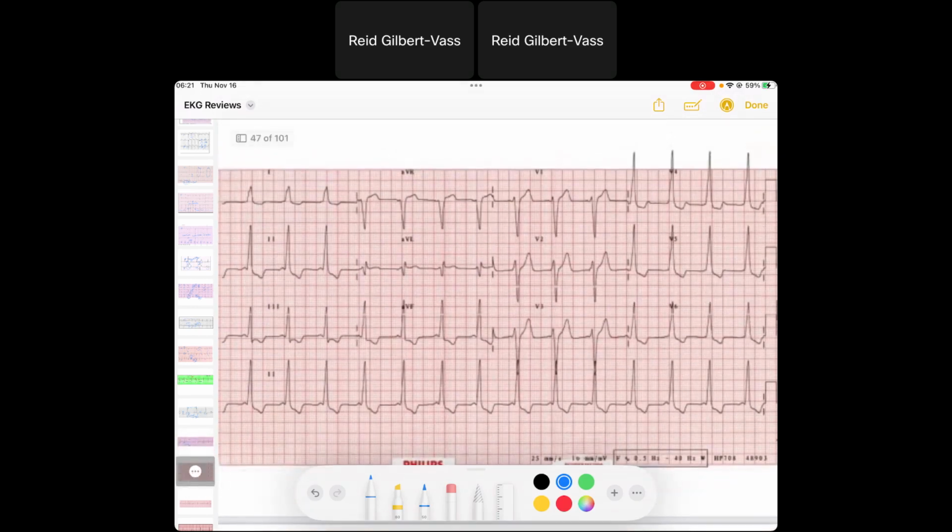Okay, so here we've got regular rhythm. QRSs are borderline wide, getting wider. The rate here is 300, 150, 100, 75, maybe 75 beats per minute-ish. And look at our PR intervals, what our AV node's doing. Actually, we'll look at our sinus node first. We've got upward P waves in aVF and kind of isoelectric P waves in lead one, so it's probably going down. Call this a sinus rhythm.